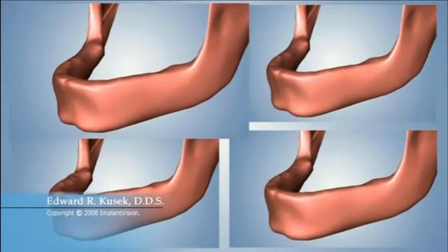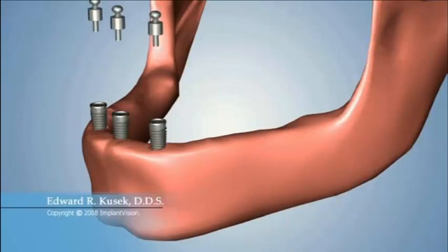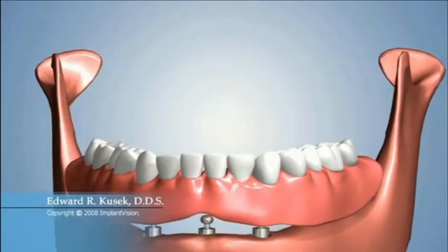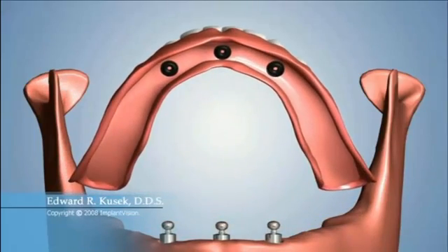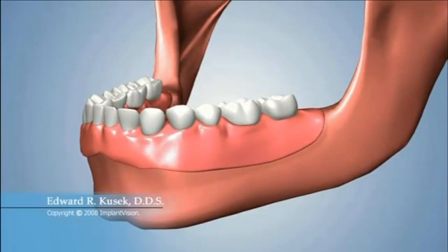One option may involve the placement of 2 or 3 dental implants. The implants help prevent bone loss and provide a stable foundation for a denture. A connection type known as the ball and O-ring attachment is used so that the specialized denture can be secured to the implants, yet removable by the patient for cleaning.